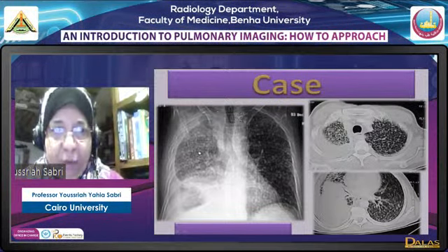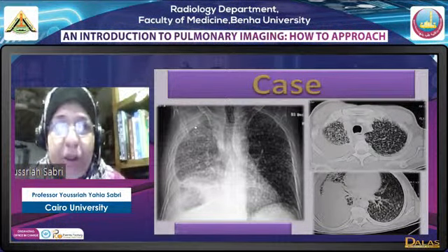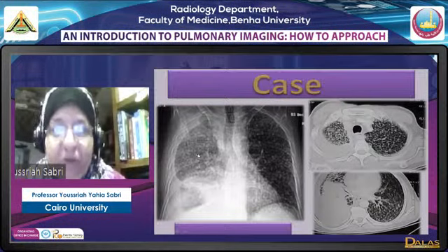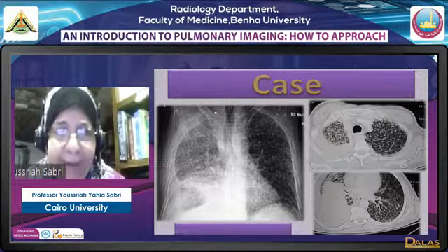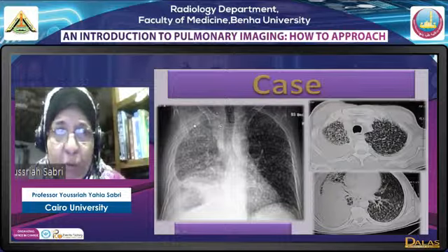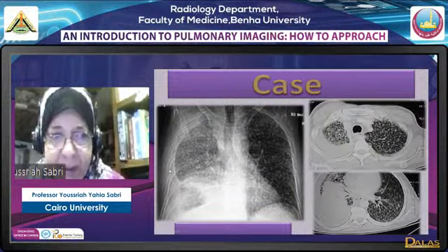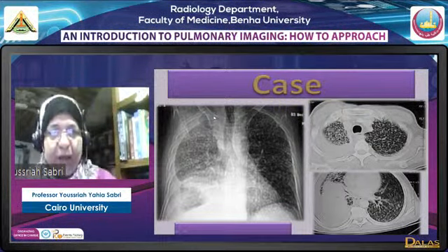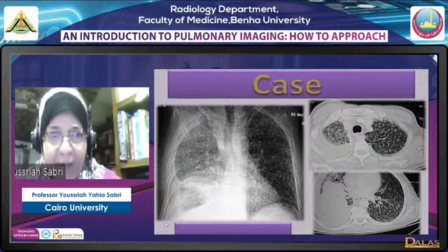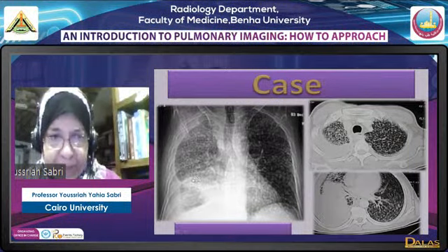Number one, if you compare both lungs, you will find veiling in the right lung because of the effusion. There will be diffuse veiling, and then there will be pleural capping here. This is the apex here. There is a pleural capping here, because water gathers in the most dependent part, which is the apex, and then it extends onto the lateral aspect and then basally. So we will have opacification apically, laterally, and basally, in addition to the veiling. This is how effusion is seen in a supine film.